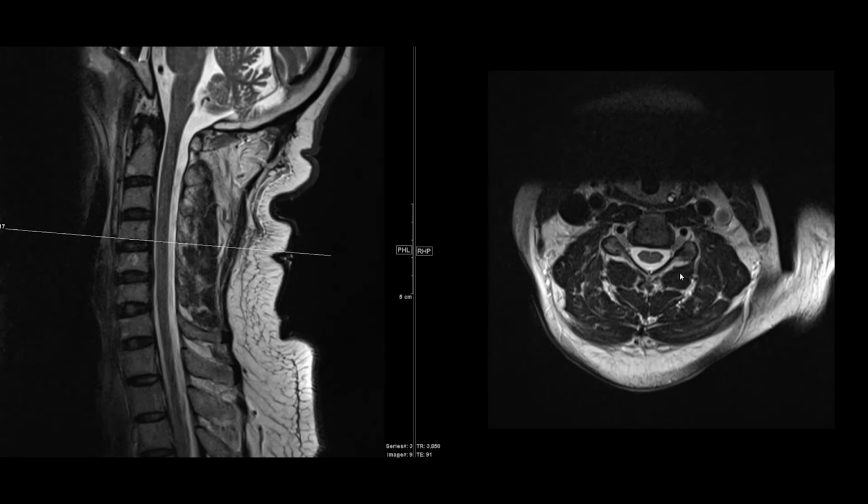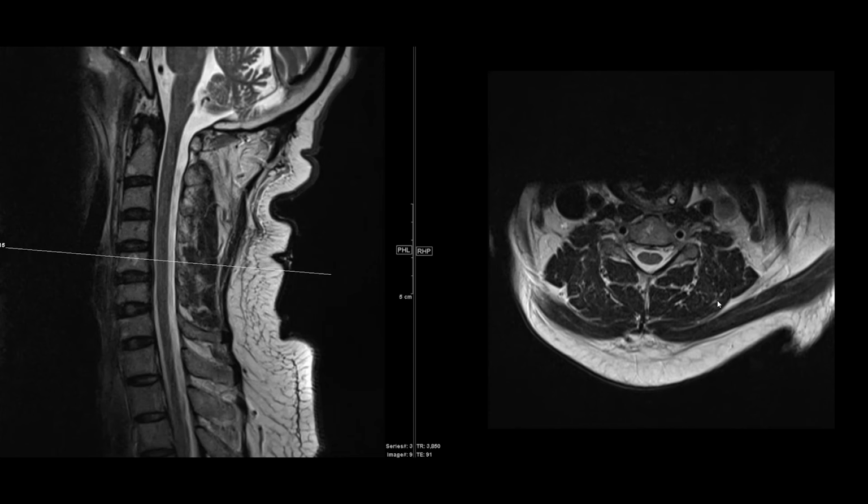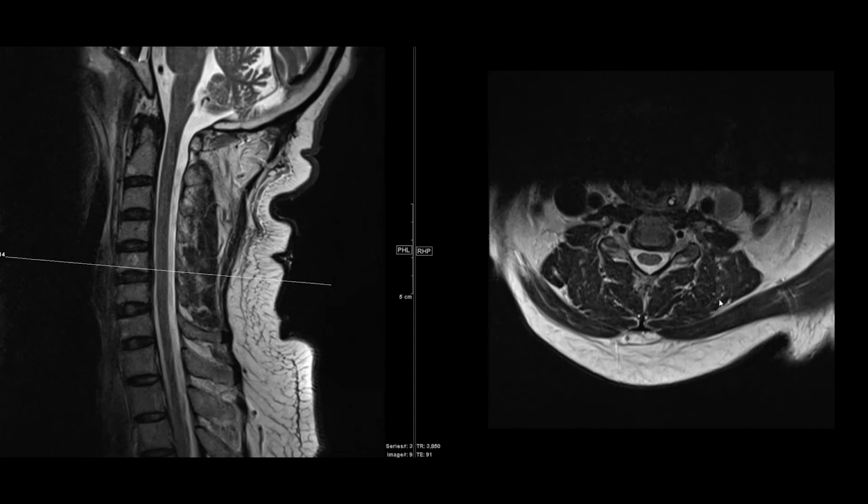And you see here at 4-5, this is not entirely normal. You've got a normal neural foramen over here, relatively normal, but you're starting to get some degenerative changes on the left here, a little bit of an osteophyte in the neural foramen there, a little bit of facet hypertrophy. There's probably some mild narrowing there. This canal continues to be patent. And as you go down, each of these you're going to give a rating.